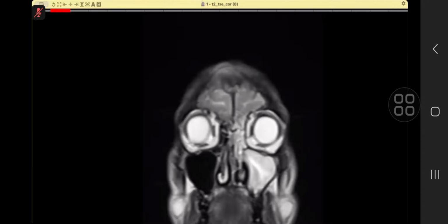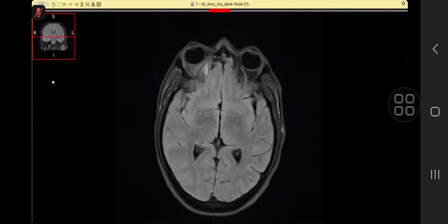FLAIR is the key for the exam because the findings are subtle, but you have to pick them up. Now you can see what is happening: there is an abscess, this is all an epidural or extradural abscess. Here at 2 places it is extending into the parenchyma also, but the rest of it is sitting along the transverse sinus. And here, this is the component which we saw on the sagittal post contrast. You remember the FLAIR where something was here.